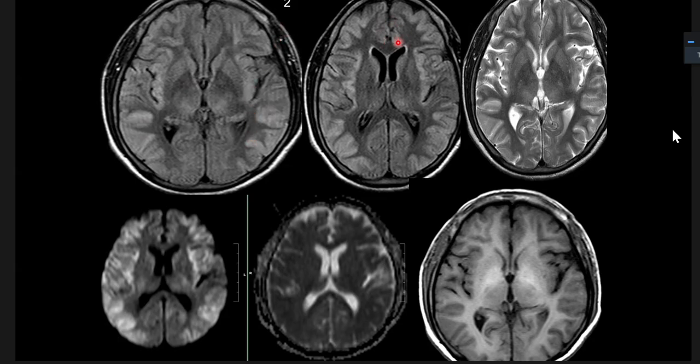What is the anatomical location of this structure? Cingulate gyrus, I feel. Excellent. Do you see this is bright? Yes, sir. Insular cortex is bright, both insular cortices. So basically, in the image shown, everything is bright at the cortex except occipital lobes. Am I correct? Yes, sir. Even thalami are involved. Am I right? Yes, sir.